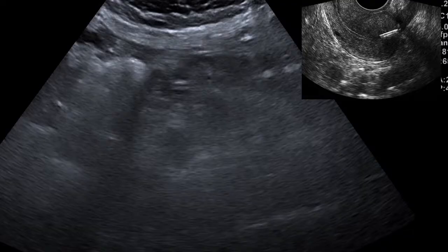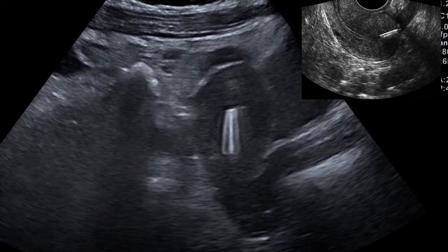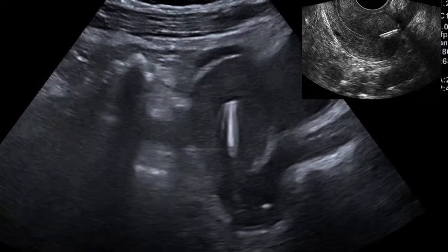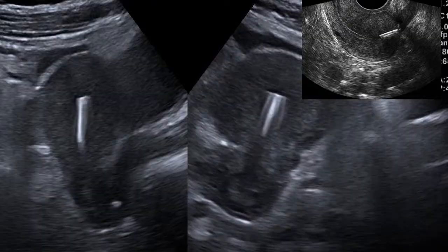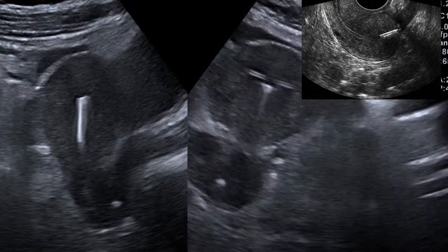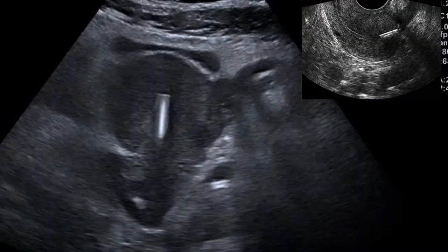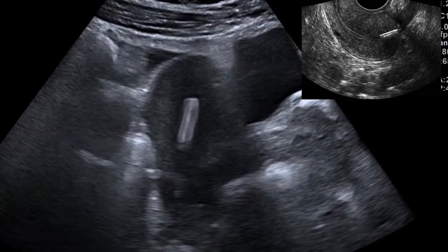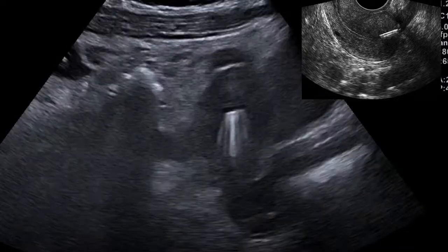The initial suspicion from the referring clinician was that it could be an inflamed intrauterine contraceptive device, or a malpositioned one, or probably just pelvic inflammatory disease, or an embedded IUCD. The patient requested removal of the IUCD because, from the discussion they had with the doctor, she thought that could be the culprit.